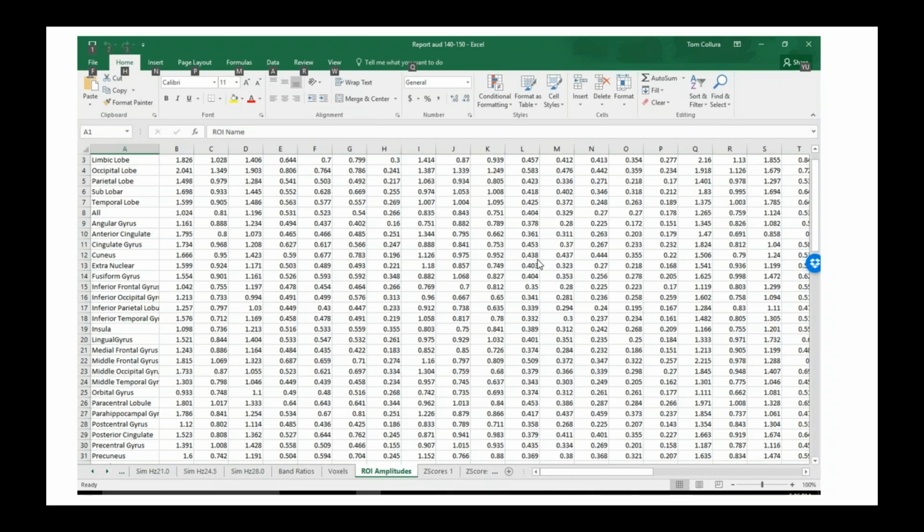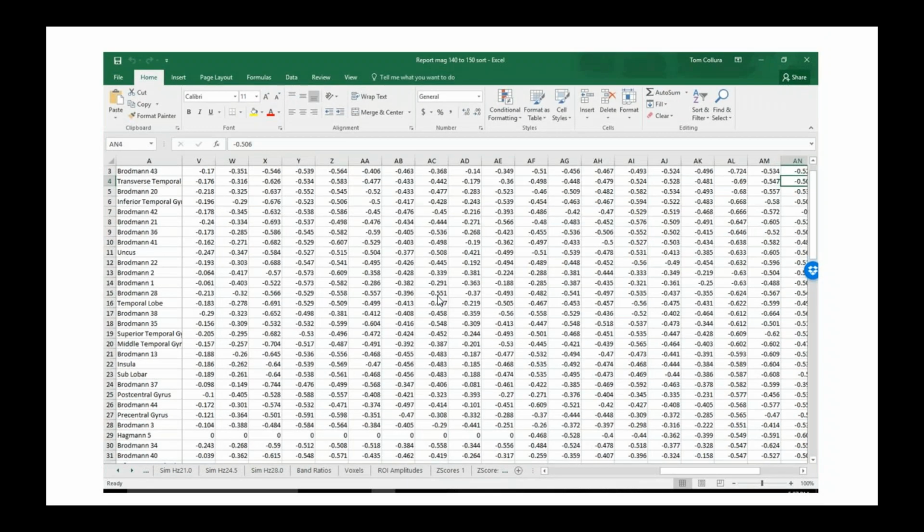You see a lot of z-scores between plus and minus 1, because it's rather difficult to get a large z-score when you do this kind of method, and we're publishing reports that show that. It's the repeatability and the reliability that gives us low z-scores generally, meaning things aren't changing. You need a z-score in the vicinity of 0.6 to 0.8 or greater for there to be a significant change. And you can see in some of these instances, we do have some significant changes. Here's another example, again showing negative z-scores show that there's a reduction.